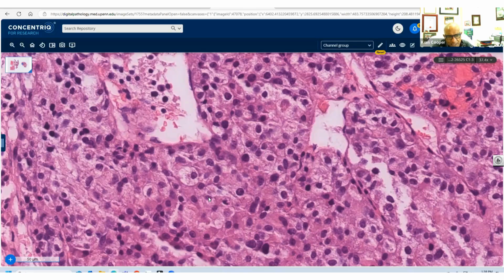That's the classic. And the other one I would mention would be paraganglioma, and you can easily rule that out with neuroendocrine markers and S100 as well. So you can get the paraganglioma out of the way, you can get the renal cell carcinoma out of the way with PAX8 and epithelial markers. Remember that these tumors can have a little bit of desmin, so don't be startled by that. But TFE3 is the main answer.